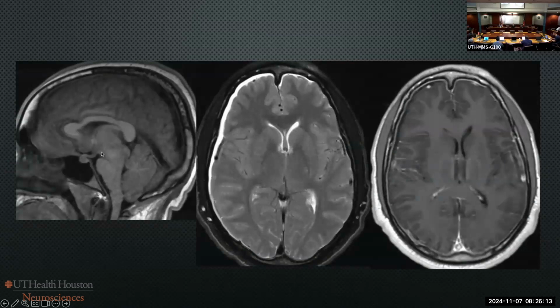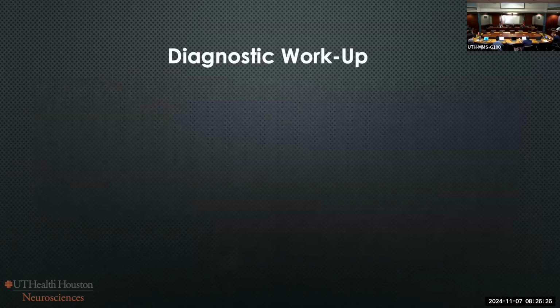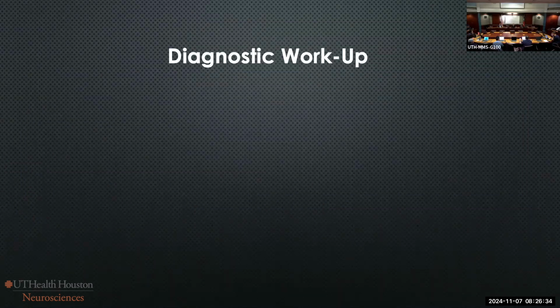He's obviously got the midbrain slump, and he's got a prominent sagittal sinus and a prominent pituitary. So he's got everything. He got a blood patch. Yeah, that was his treatment. No diagnosis. He had some imaging, and there was a suggestion that he had some pitting at the skull base. So you go, well, what does that have to do with it?